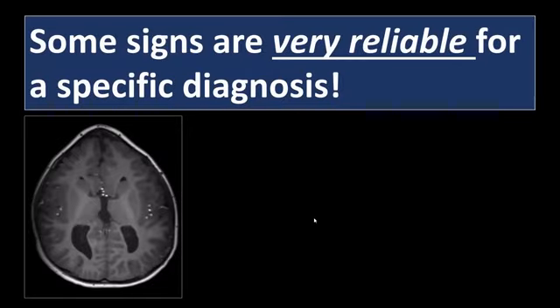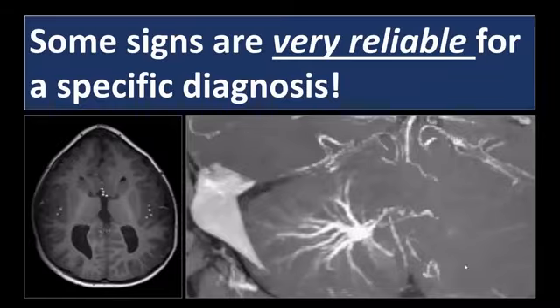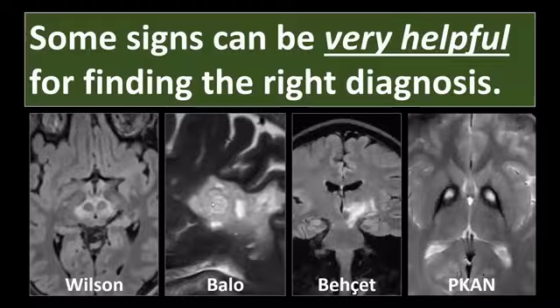If I see a lateral ventricle shaped like this, I know I'm going to see some kind of dysgenesis of the corpus callosum on the sagittal image. If I see this image on a T1 weighted image with gadolinium, I know there's going to be a developmental venous anomaly, just because it just looks like that. We see the caput medusae sign and a lot of snakes on the head of Medusa. So there are some signs that maybe aren't 100% pathognomonic.